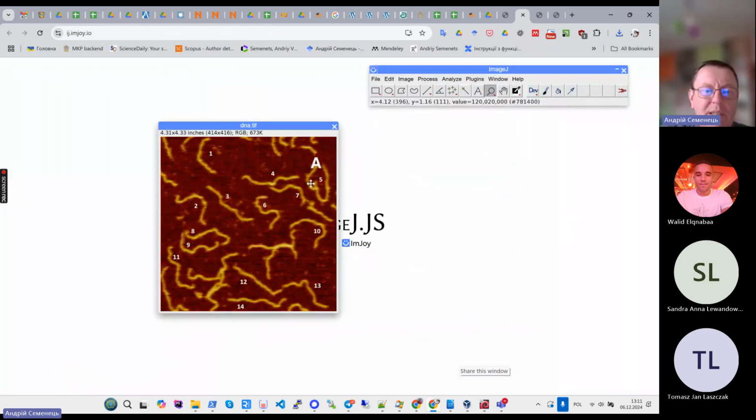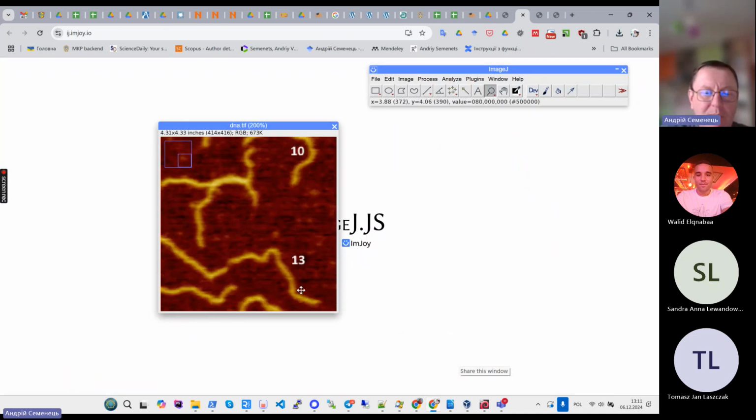And when you need to make a selection, let's say I will use variant 13, you have to use a segmented line. If you see some instrument containing a small red triangle, right-click, switch to another type of instrument, and instead of a straight line, I can draw a segmented line, and double click will finalize my selection.